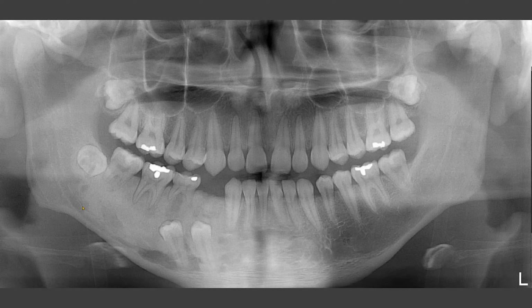We can see that the inferior alveolar canal is displaced to the inferior border of the mandible. In many cases, you will see that the canal is actually displaced superiorly. Also note that the crowns of the right premolars are much wider than the left premolars. This also means that the right premolars are displaced lingually in addition to being displaced inferiorly.